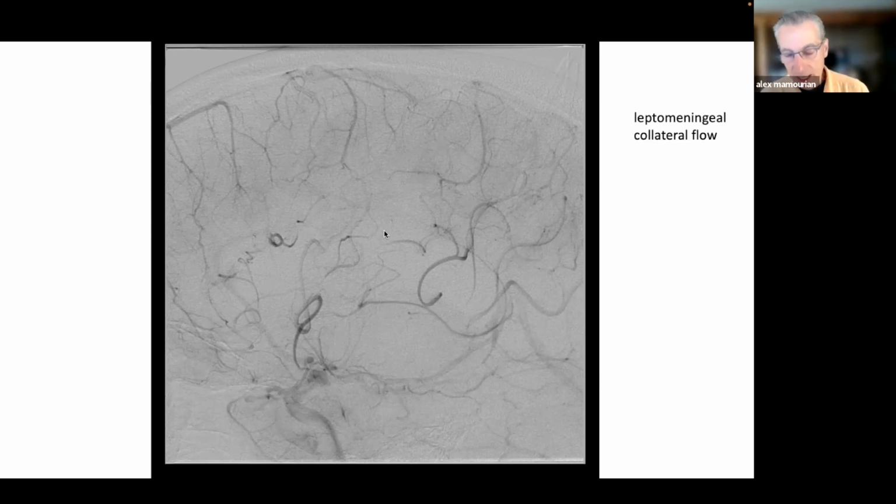So in this case, the anterior cerebral artery is supplying much of the territory of the MCA in this patient through these collateral flow. This is why you'll see patients who have a proximal occlusion of, for example, the MCA, and yet there's only a small infarct visible on the diffusion-weighted MR scan.